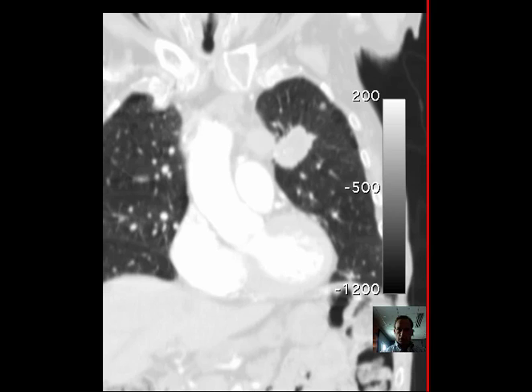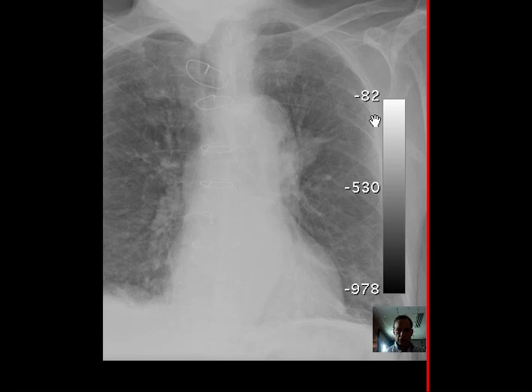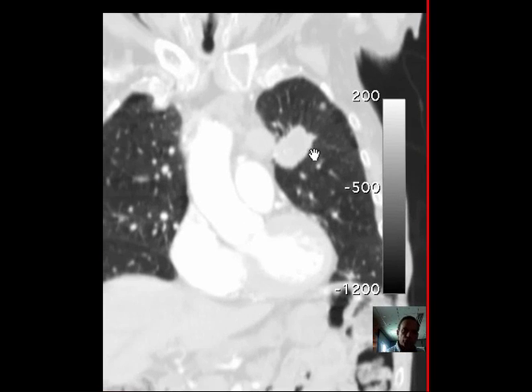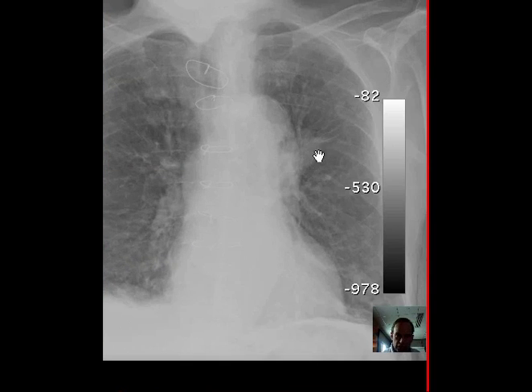In fact, if you look at the CT like that, and then you look at the chest radiograph, you get a lot of correlation. So then you can start thinking, well, I know there's adenopathy here, and you think, well, maybe this is a little bit fuller than the aortic arch should be, etc. So it kind of gives you an idea of how much more you can see on CT, but it also gives you an idea when you look at a chest radiograph that you're seeing sometimes just the tip of the iceberg, and especially when it comes to lung cancer, there could be lots of stuff going on in the mediastinum here that could be very hard to see. And that's it.